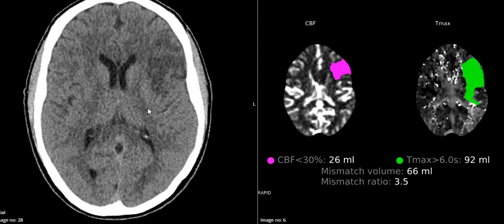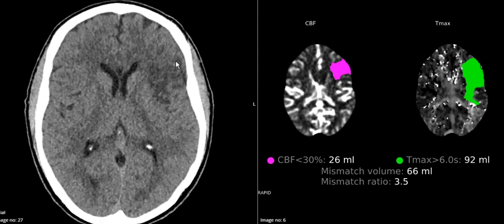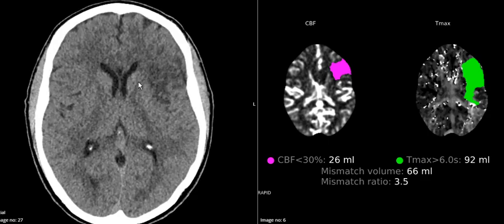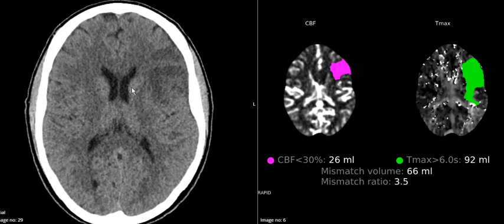So more water is inflammatory changes, and those inflammatory changes are because of ischemia, and the ischemia is the lack of blood flow, and the ischemia was caused by a blockage of the mid cerebral artery M2 branch. So very subtle changes here, and we know if we look for them that we are finding them.